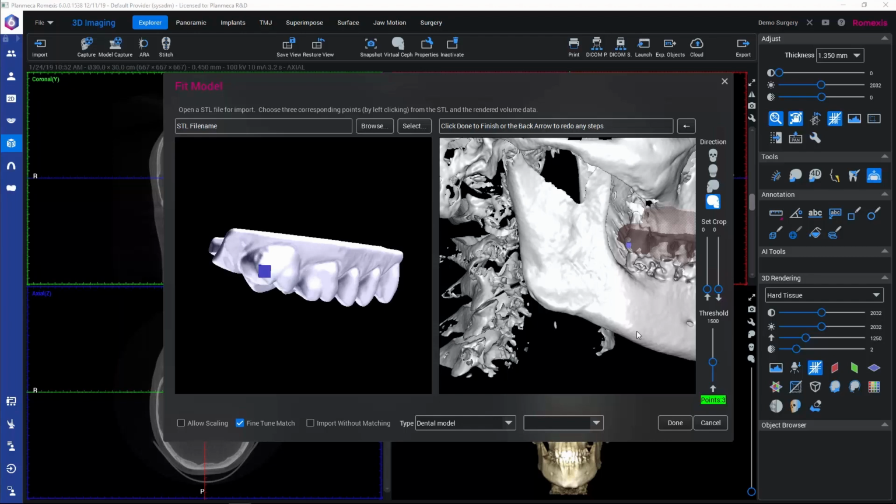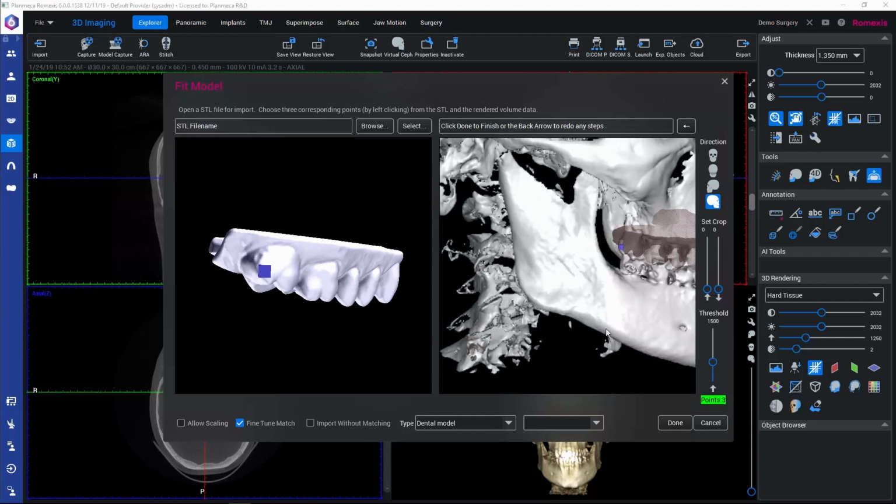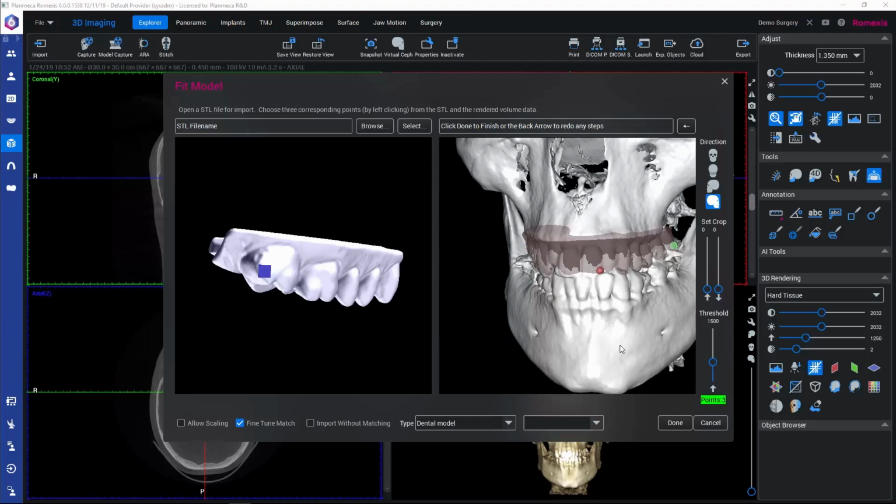We can see on the lower right side of this dialog that we have marked 3 points, and the background behind those points is green. That means that we have successfully selected the points. If it would be yellow, there might be the risk that it could be a little more difficult for the software to match those models.